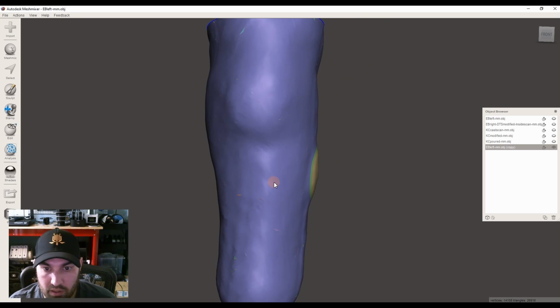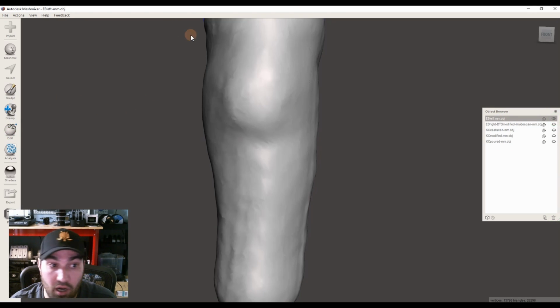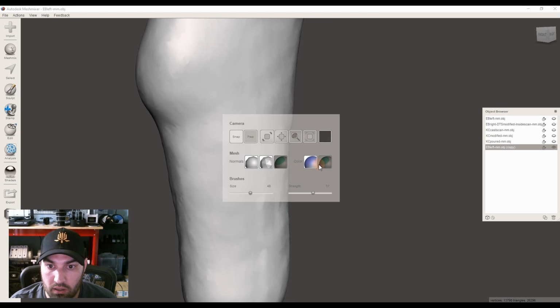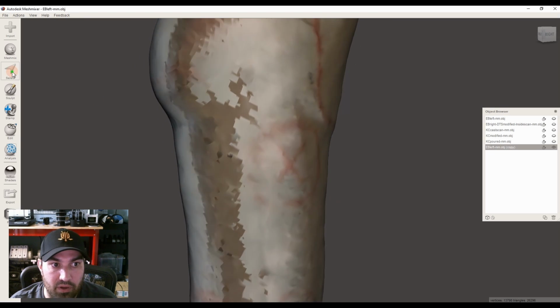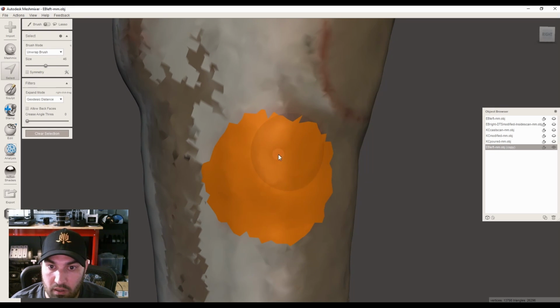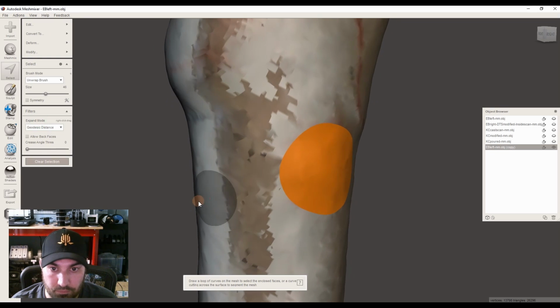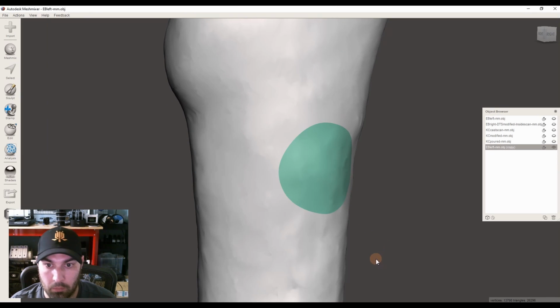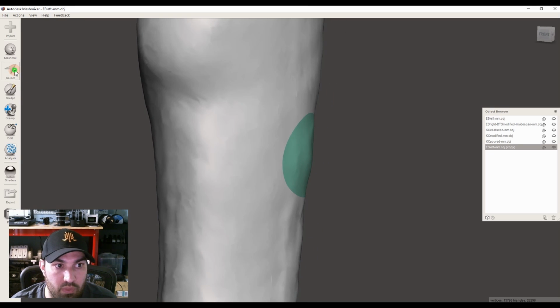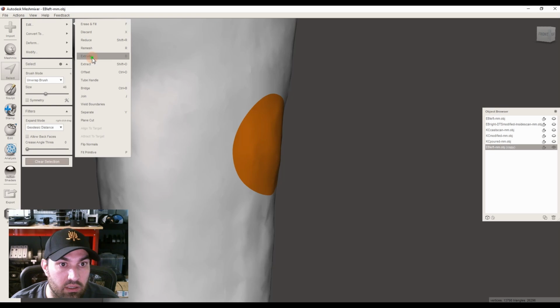So another way to do that, let's delete that model, make a new duplicate. You gotta turn it on before you can do any of this. So edit, duplicate. And let's come back here and look at it a different way. So another thing you could do, select that, smooth it. And let's actually take that and extrude it again.